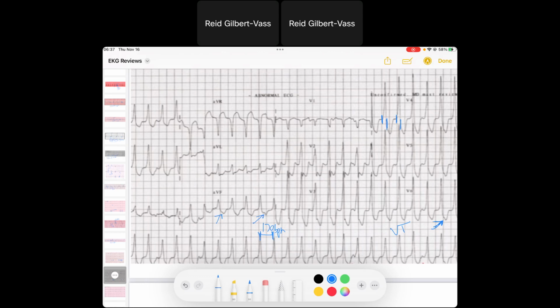This is a tough one though. So you could argue that this isn't VTAC, and sometimes you could get fooled. But I would say, depending on the patient scenario, this would be VTAC. But given the clinical situation, you would want to make your own assessment.